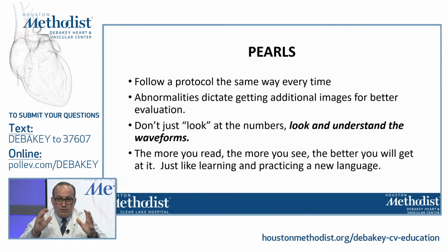But look and understand the waveforms. Personally, I think that the waveforms give you so much more ability. You can tell that there's a stenosis or not based on the waveforms alone. And then the velocities will help you determine how significant it is. Is it 50%? Is it more than 75%, etc.